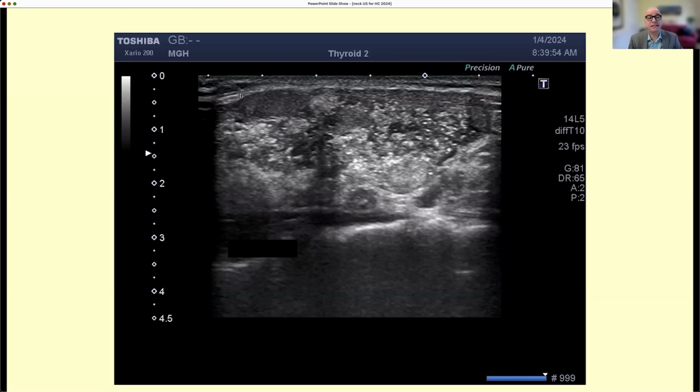Well, it could be that there is Hashimoto's thyroiditis, but there are multiple calcifications throughout this gland. It's impossible to see these bright reflectors in bona fide Hashimoto's or Graves' disease only. The fact that these are actually calcifications is given away by the fact that when they are very dense, they produce a shadow. That's a telltale that there are calcifications.